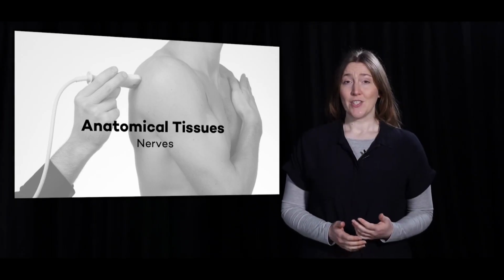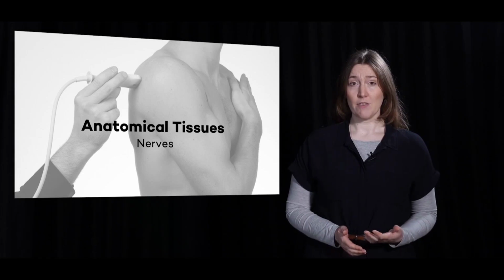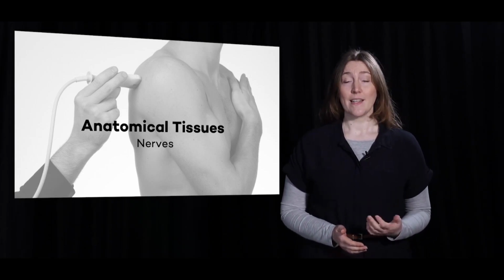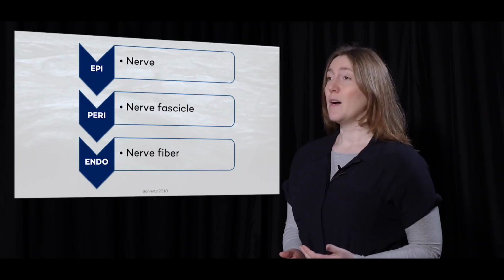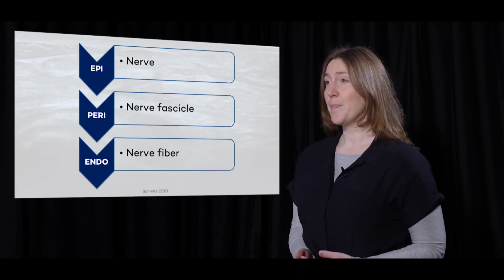The goal of this presentation is understanding how to recognise nerves and their specific architecture and characteristics when scanning them with ultrasound. A nerve has different parts. One of the smaller entities of a nerve is a nerve fibre.